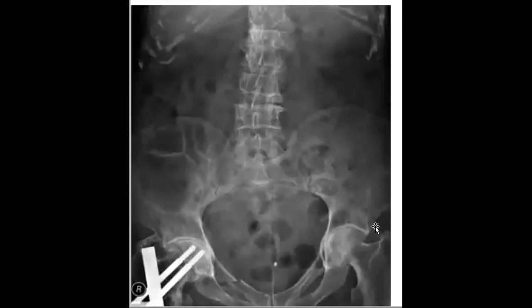Finally, you have a patient with multiple issues, especially degenerative spine disease, osteophytes, maybe some mild sacroiliitis, and osteoarthritis, and this patient already has fixation. So this is what is called distraction. You are distracted by many issues, but the acute condition here is a pubic fracture.